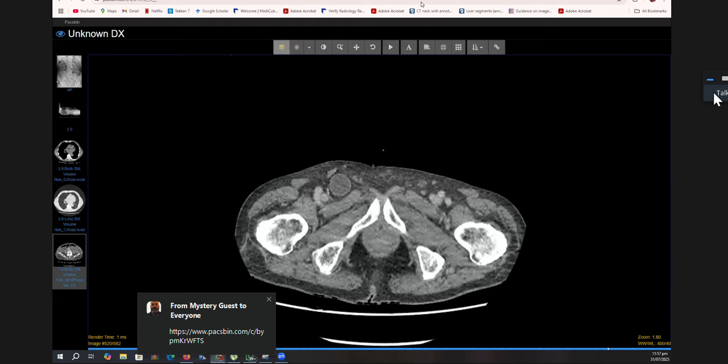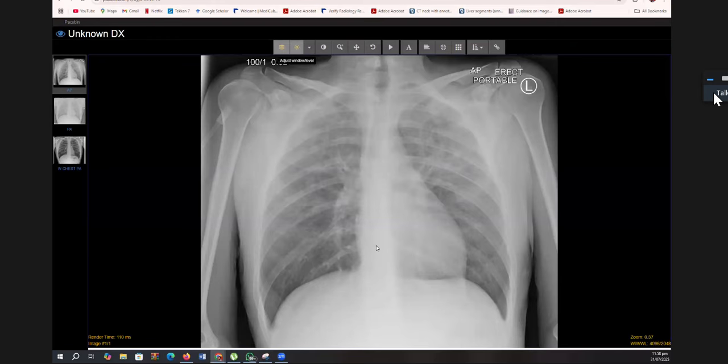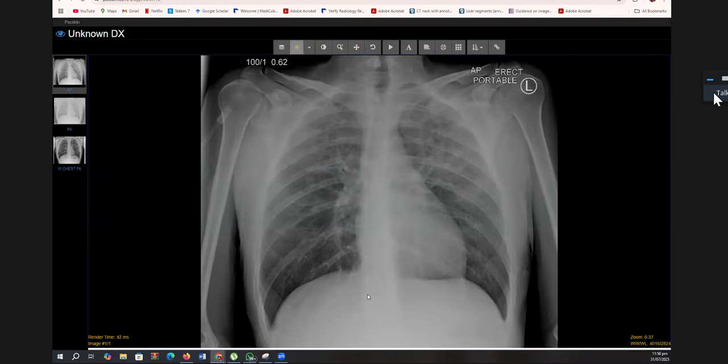Have a look at this one. We're going to race through just so I can see some more films, and you can see some more films rather. Have a look at this one. This came through in May 2020 at the height of the COVID-19 pandemic. It's a young man with a dry cough and fever. It was in the days before we had widespread testing for COVID, so there was no lateral flow or PCR tests.